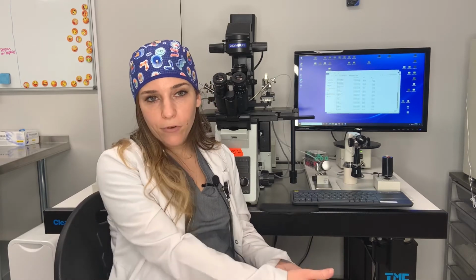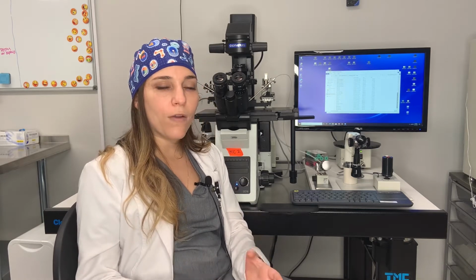Embryo grading is extremely important because it is the only way that we can assess an embryo in the lab. If we don't have anything to go off of, what kind of data can we collect for the patient? Things like FERT rate, blastocyst rate, viability rate. Where does your embryo stop growing? Did it stop growing at FERT check? Did it stop growing on day 4? Did the cells never compact? These things have specific roles inside of the embryo, and it's important to understand what factors impacted a negative outcome.